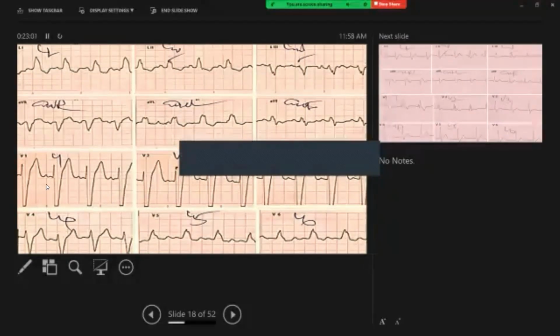Now in this patient, this R wave indicates that this is ischemic left bundle branch block, could be acute or old. In non-ischemic left bundle, usually you can't see this R wave, you will see only the QS complex, complexes like this, QS complex.